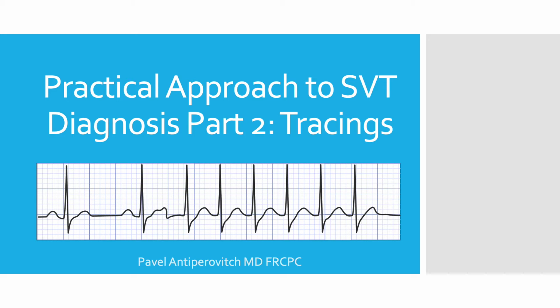Hello and welcome to part 2 of the Practical Approach to SVT Diagnosis series. In part 1, we focused on building an approach to SVT tracings, formulating the differential diagnosis, and understanding the mechanisms of arrhythmia. In this video, I have a number of tracings and diagrams that will allow us to apply the concepts we learned in the first video.